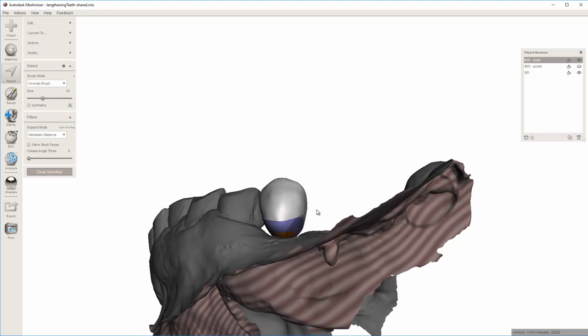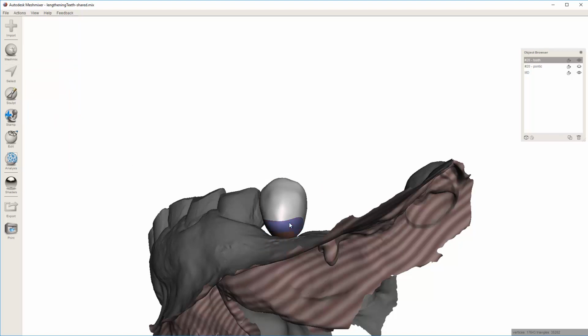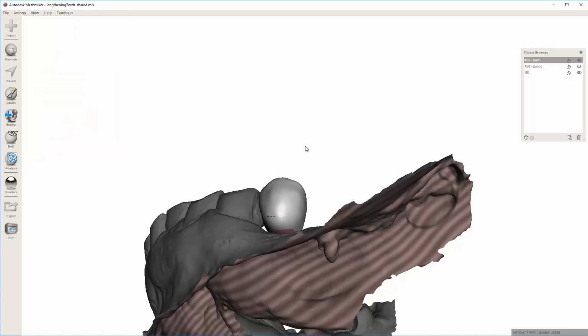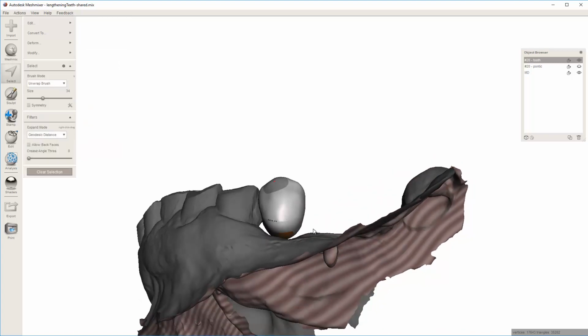And so now Shift T gives me that same result, because of the surface group. Control Z, that purple one. I'm going to double click this and remove this face group, this purple one, with Control Shift G, clear face group. Okay, so now I'm going to double click on this and hit Shift T.